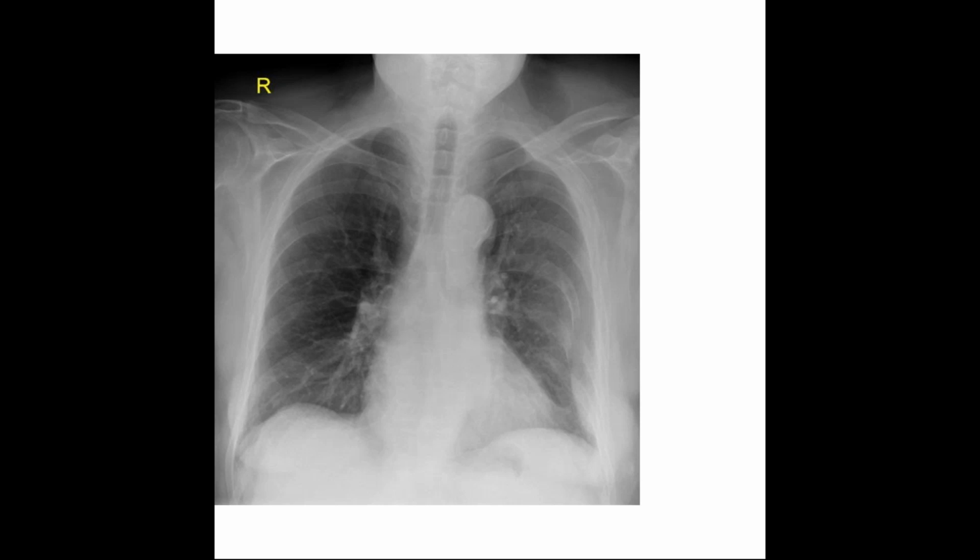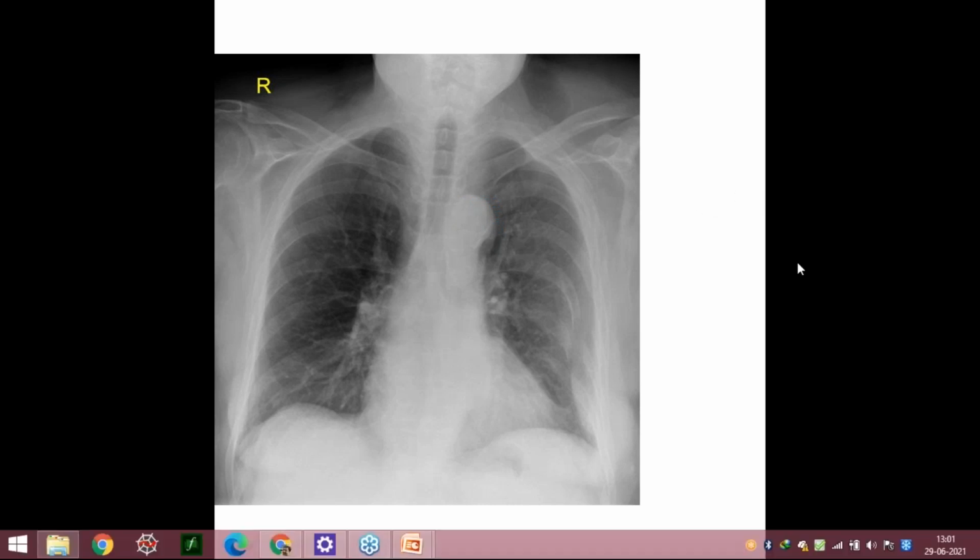Aortic knuckle dilation. Okay, I can accept that, but again, it is not air near the aortic arch. What I was telling you about was that this knuckle has got calcification. You see this? I'll show you. But that is not what I put the X-ray for. That is just another finding in this X-ray that is very good for you to pick up. Air is not there. It is this slight calcification.